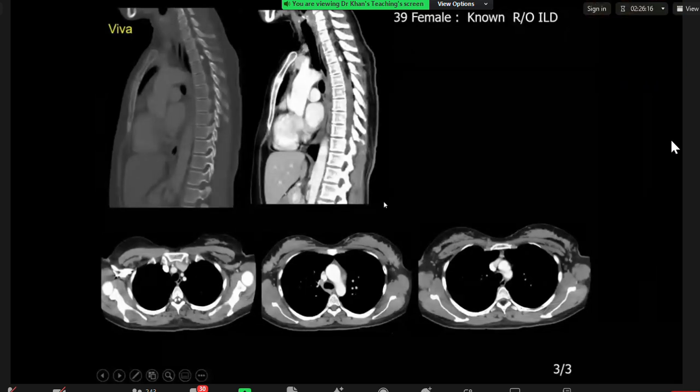Yes, I've got sagittal CT on bone windows and soft tissue, and I've got a hyperdensity at the level of the upper thoracic spine, and that's also associated with low density within the spinal canal. On the axials, it's clearer that there's two foci of hyperdensity within the canal. Then in the second, looks to be normal cord, and then in the third image there is low density.